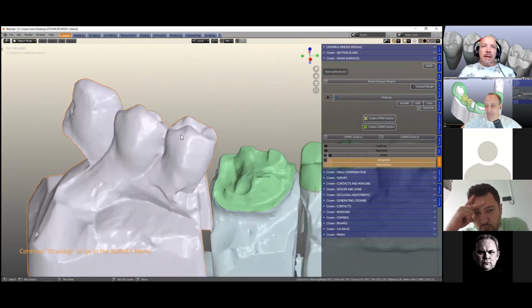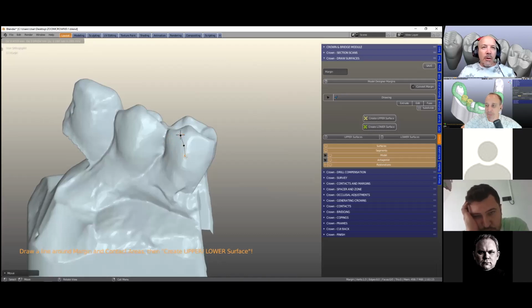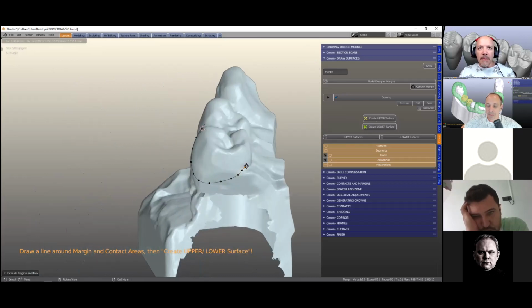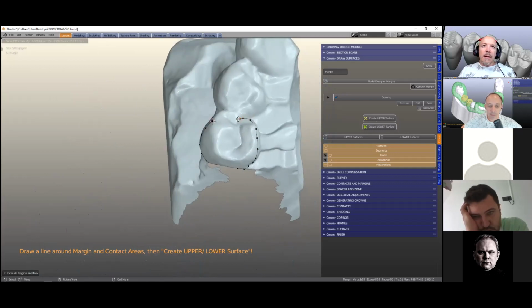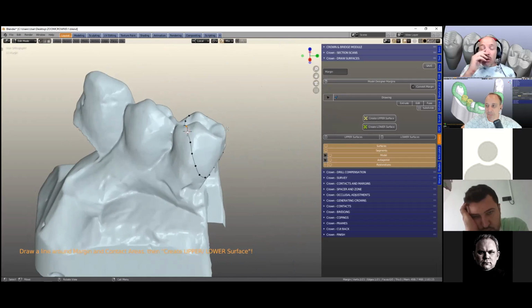So this is a contact model. Again, we're using the G and the E. We've got this extrude button, which I personally don't like that much because my muscle memory goes with E and G. Okay, now we are cutting the mesh. We're duplicating this and actually cutting through the mesh. Usually, like 95, 98, 99% of the time, it cuts. If it doesn't cut, you can subdivide it and then it cuts. Okay.